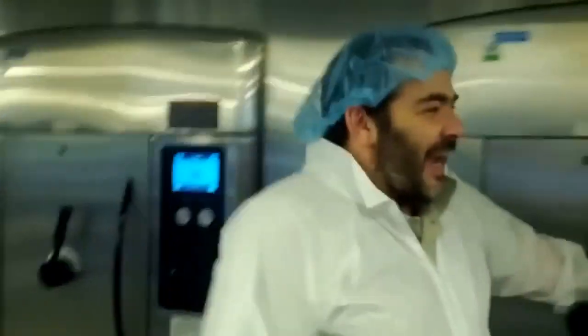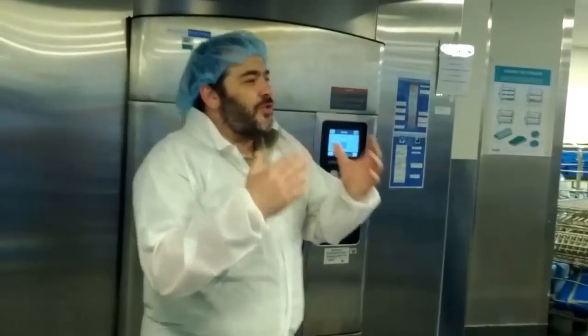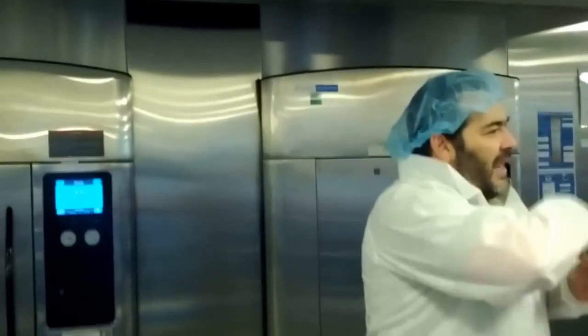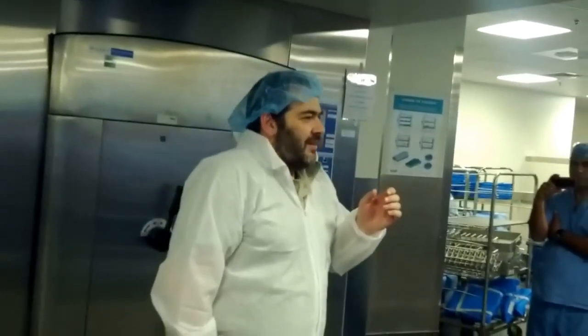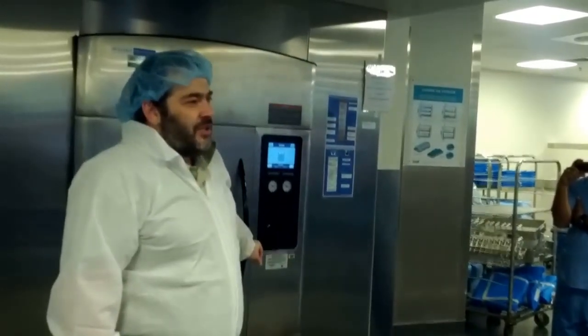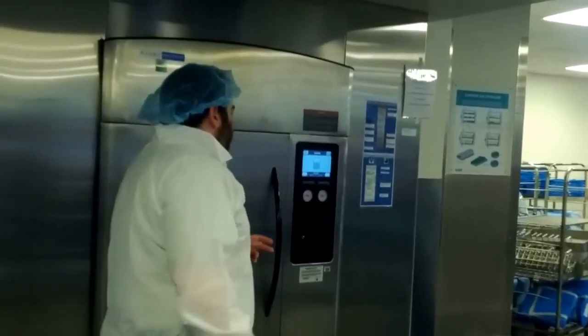So as I mentioned before, a biological indicator has to be put down in front next to the drain. Next to the drain would be the last vestiges of air that hasn't been removed. A pocket of air would make it more difficult to sterilize. That's where we put our biological indicator, because if we can sterilize down there by the drain, we can sterilize anywhere in the chamber. That would be the assumption.